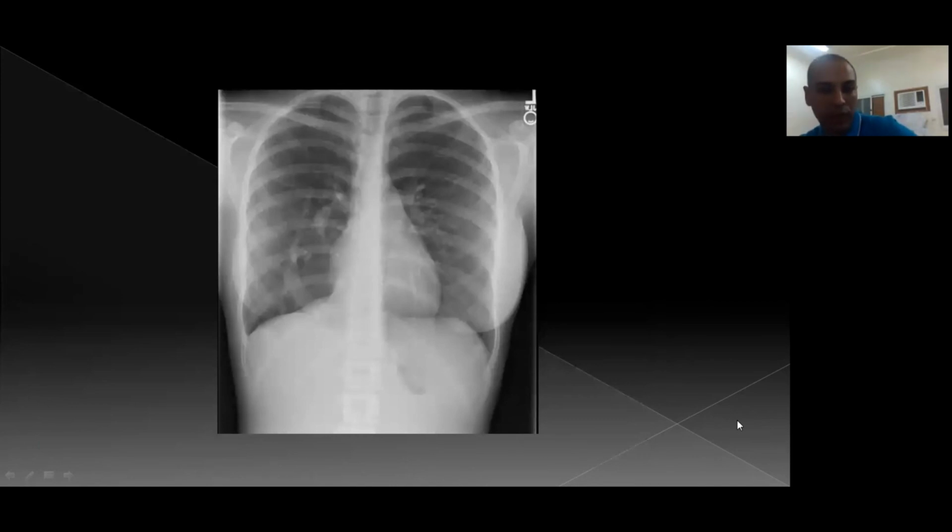I think we have two slides. I will go ahead with this very strange chest X-ray. We have something like an opacity going from the hilum downward to the right diaphragmatic copula. This looks like scimitar syndrome, an abnormality in the pulmonary venous drainage. Sometimes we see this opacity and couldn't identify it.